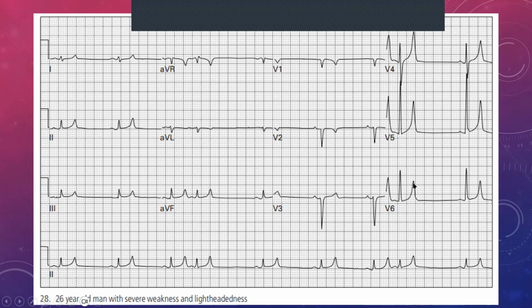Now, would anybody be willing to take a guess as to what tall pointed T waves might indicate? Because it's an important diagnosis for people to know whether you're working in emergencies, ICU, anesthesia, or medicine. This is an ECG pattern, a tall T wave, peak T wave that's quite sharp. In other words, a T wave that looks like it would be painful to sit on.